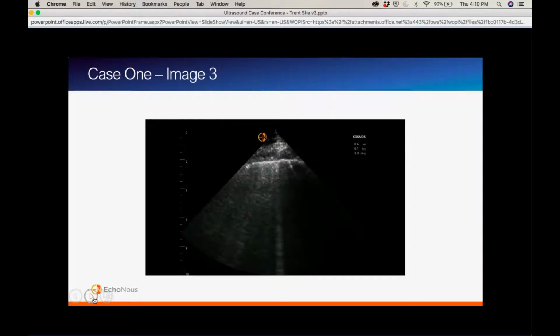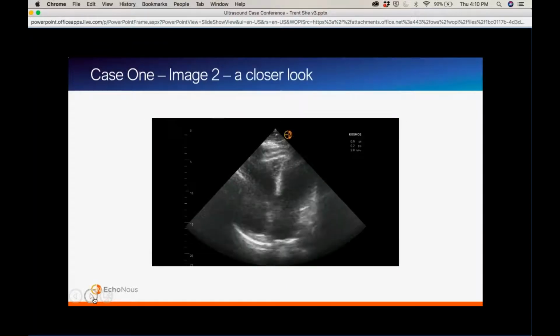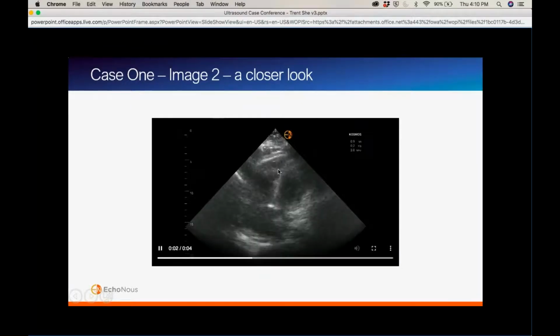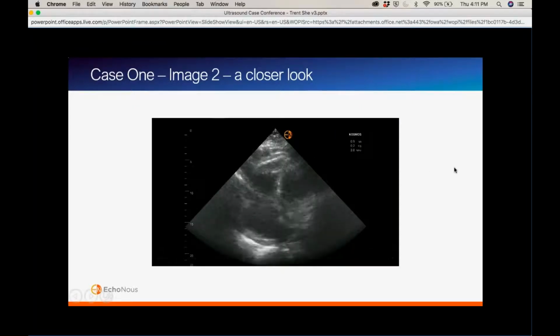We did eventually get a CTA, and oddly enough, the CTA didn't show any signs of pulmonary embolism, but it showed this really odd finding in the tip of the right ventricle. There was this area of incomplete filling, suggestive of a right ventricle thrombus on the moderator band itself. And there was some RV dilation that was seen on the CTA as well.